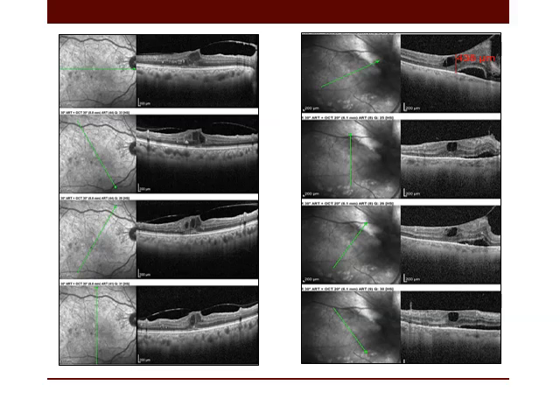Anteroposterior contraction of the posterior vitreous can lead to this picture in the center of the macula. So this is an anteroposterior traction with evidence of foveal changes, cystic changes. Also anteroposterior traction of the posterior vitreous with cystic foveal changes and tractional detachment that is threatening the center of the fovea.